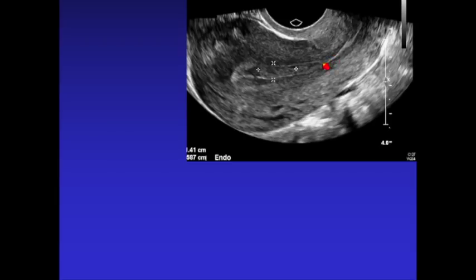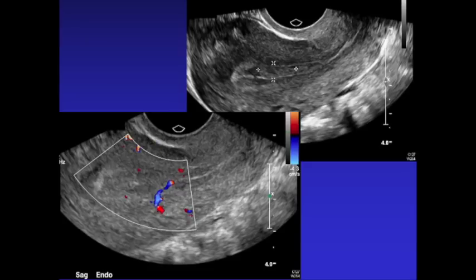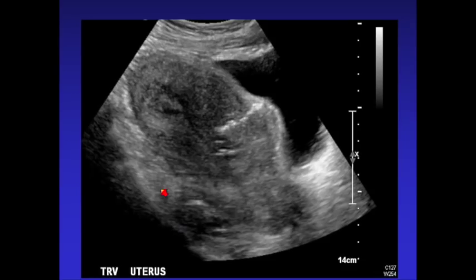Well, if you look at the endometrial echo in the mid-uterine cavity, and it is within the endometrium itself, that must be retained products. That's not blood clot. Blood clot is going to distend the endometrial cavity. It won't be just on one side like this. So I know, well, maybe she had a polyp before she got pregnant, but since she's recently been pregnant, it's likely retained products. And here's another patient with a small area with a small bit of blood flow here, and even though it's just a small area here, I can be very, very confident that it's most likely retained products.